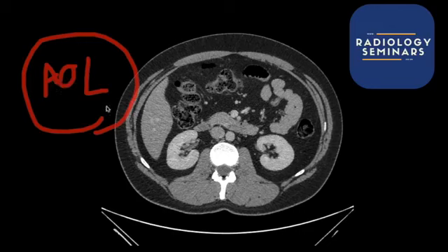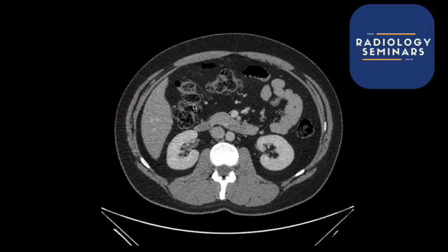It's really silly, I know. Some of you might be scoffing at me like, why on earth would anyone use that phrase? It's something I used to use. Thankfully, I don't need to use that so much anymore. So the aorta is on the left. So this is the aorta. This is your IVC. So now you know that this is venous and this is aortic.